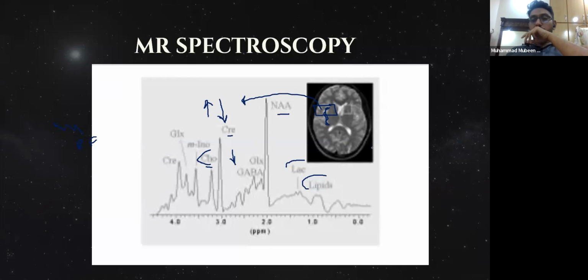The other molecules are depicted in different diseases. NAA is raised in Canavan disease, which is a demyelinating disease. Lipid and lactate are raised in any kind of abscess, which helps to differentiate it from a metastasis. In the brain, metastasis can have a very confusing picture, like a rim enhancement similar to that I've seen in abscess, and these kinds of things help us in differentiating.